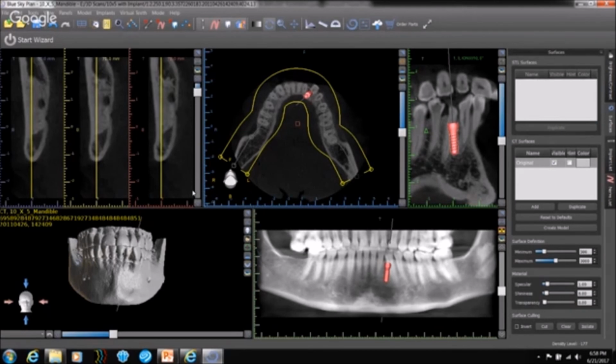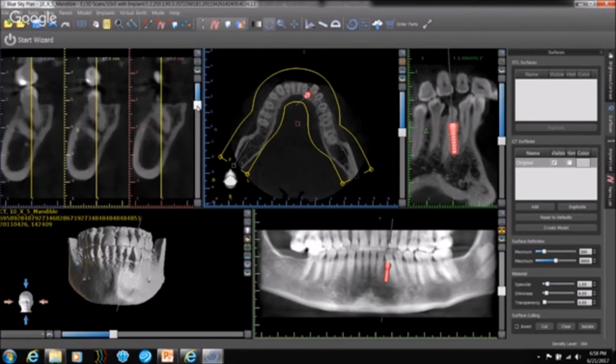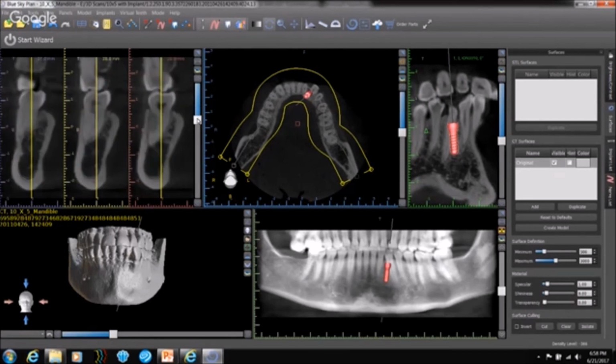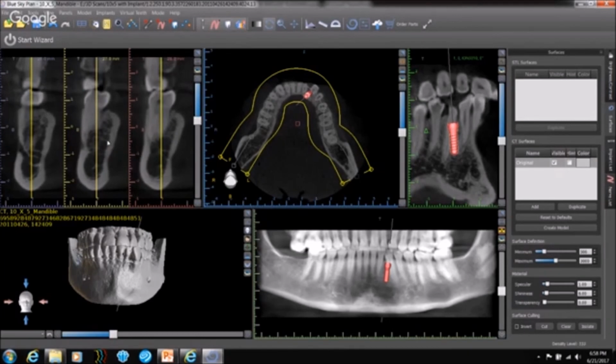Okay, those empty spaces are what I referred to in the earlier part of the webinar. Let me see if I can see that. Those are usually bone marrow spaces, just like how you saw. This is a clear example right over here. You can see the canal. This is the canal. This is the foramen, but you see an empty space right above that. So that is nothing. It is a bone marrow space.